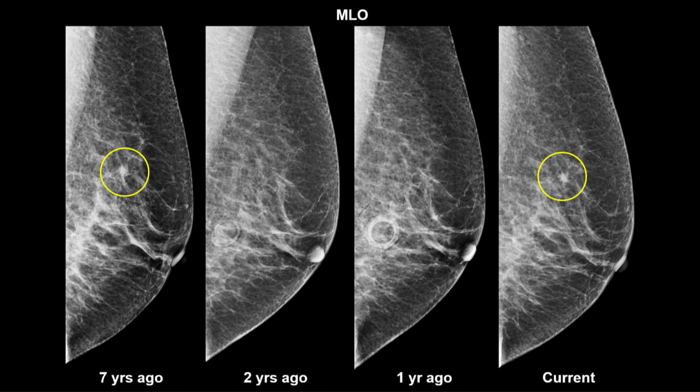Well, with X-rays, it's a lighter shadow. But the same concept, it has to align perfectly. And for very small findings like this, it only aligns every once in a blue moon. But this is superimposed normal tissue, even though it looks spiculated. And you don't have to recall it, you're done.